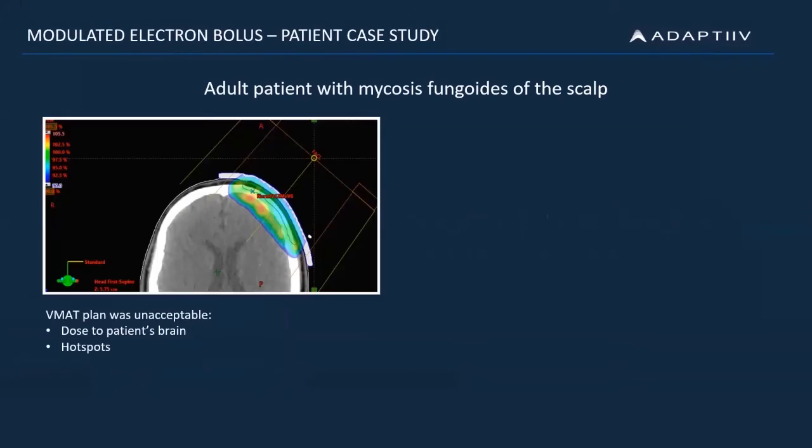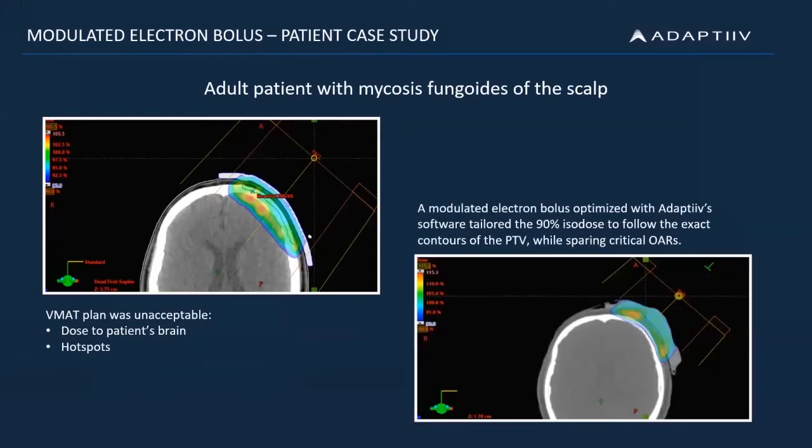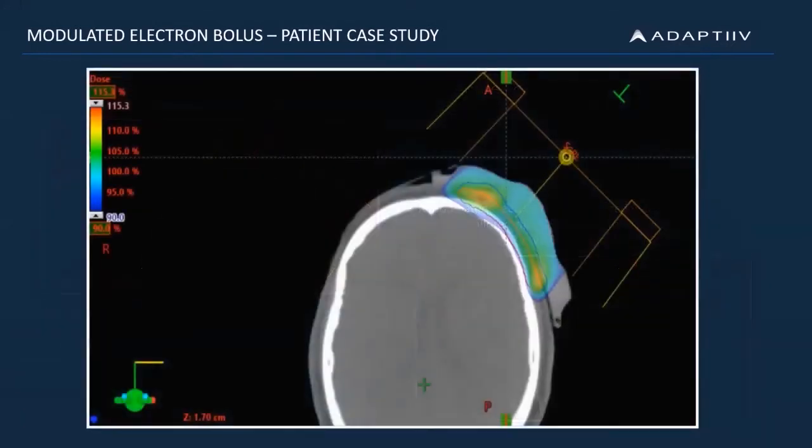This case involves an adult patient with mycosis fungoides of the scalp. The original plan is clearly unacceptable due to the dose received by healthy tissue, the brain in this case, and the notable hotspots. Adaptiiv's algorithms optimized the bolus created in the TPS, which changed the surface shape and tailored the 90% isodose to follow the contours of the PTV while sparing critical organs at risk.